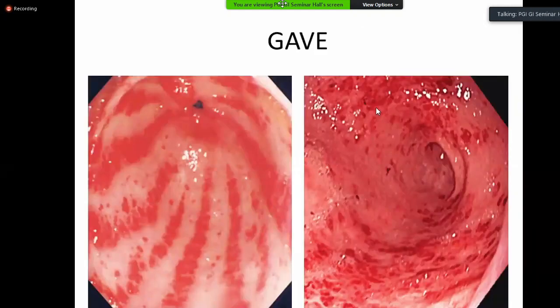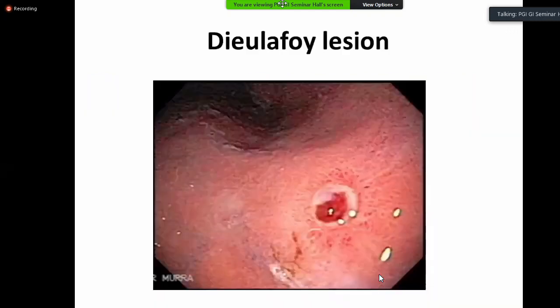The lesions can be seen all over the stomach, towards the antrum in a stellate fashion, the classical pattern where there is orientation towards the pylorus, or it may be a mosaic pattern circumferentially in the antrum with reddish or hemorrhagic spots.